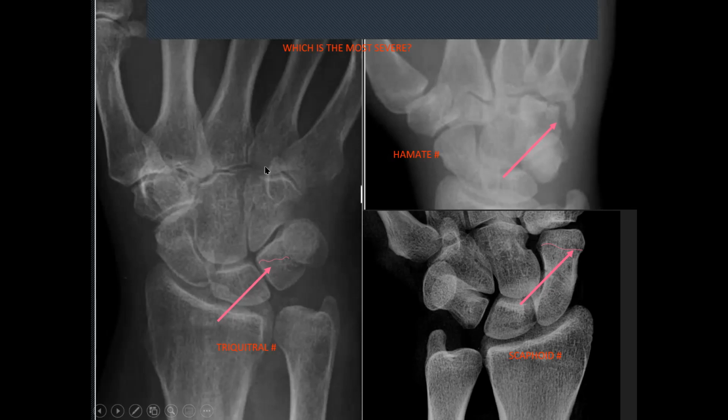So in these ones, if you are clinically suspicious, remember you treat patients, not x-rays. If the patient has, and these do cause severe swelling, patient needs review by an orthopedic surgeon or an orthopedic MO, somebody who's got more experience at reading these, or at least a radiologist should have a look at them as well. All right, so please remember to do that, because these can be very subtle. That's the whole point of showing you these. They may not be common, but they do occur.